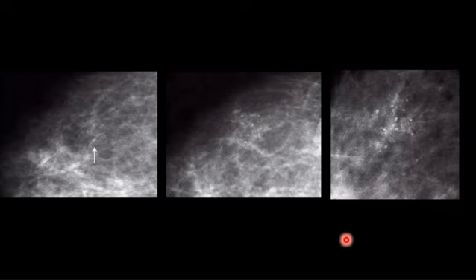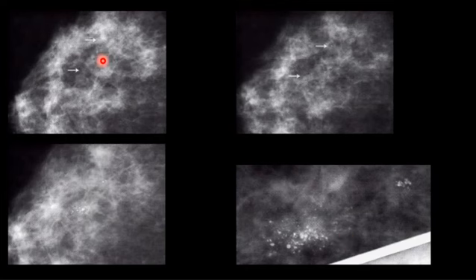Follow up. You cannot do an invasive procedure like a biopsy, for example, on every tiny spot of calcification. If you have this kind of tiny calcification on a mammogram, you cannot do a biopsy for that. Okay, they're so common. We had 2 sessions just for benign calcifications. There are many lesions that can show this kind of calcification. You follow it up after 1 year. If it's increasing in number, increasing in shape, there is some mass developing, then you do the biopsy.